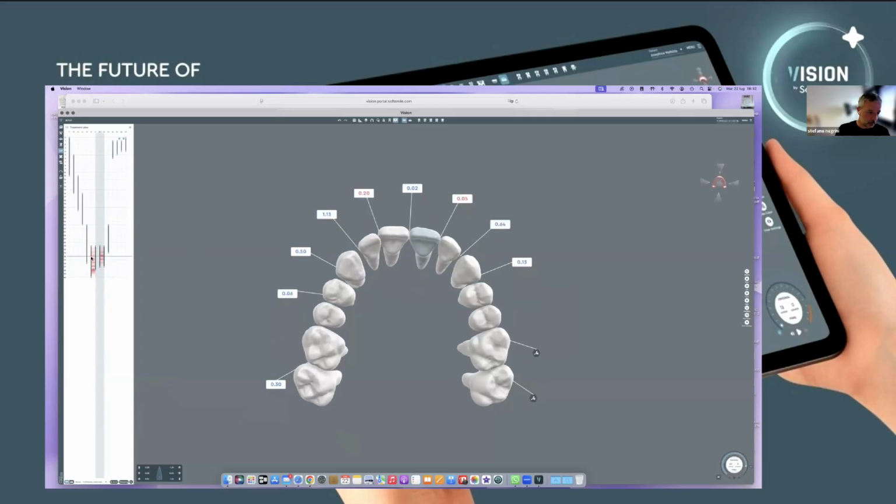Okay, now I want to put in this one. One canine is this one. Let me check. 1, 2, 3. 1, 2, 3. Let me check. 1, 2, 3, 4, 5.